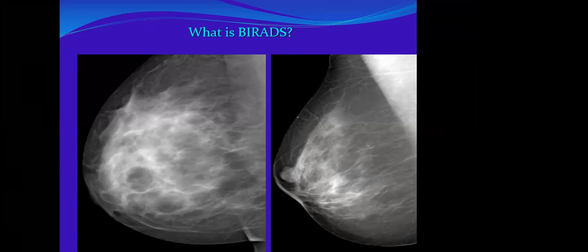Hind, Sarah, Hannah, how do you describe this one? What is the description for this? And you have even seen this case before. The first image is the previous one, and the second is the second scan, so it could be a developing asymmetry. No, this is the CC and MLO. No, these are different projections. Only different projections.